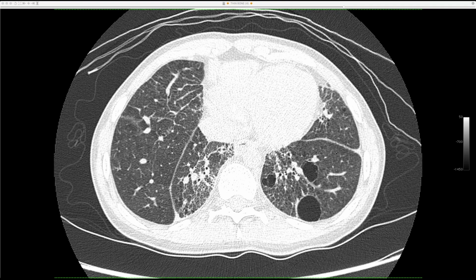Thank you. The other thing that I see, which I can't explain, and it's not florid, but it's almost as if she's got maybe subpleural edema related to the fissures.